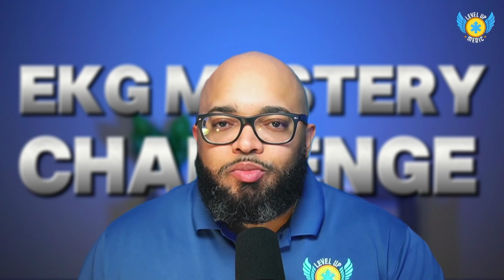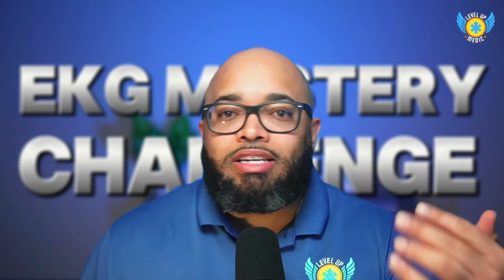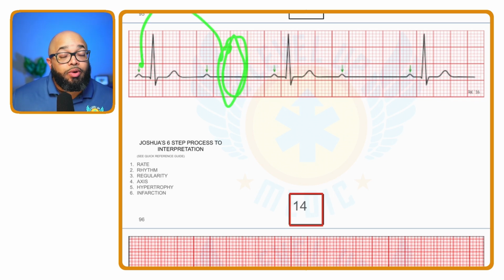when we have a dropped beat, we're suspicious for a second degree, but we have to figure out, is it type 1 or type 2? What we're going to do is go to where the dropped beat should be, where a beat should be. Go to the dropped beat, we're going to go to the PR interval.